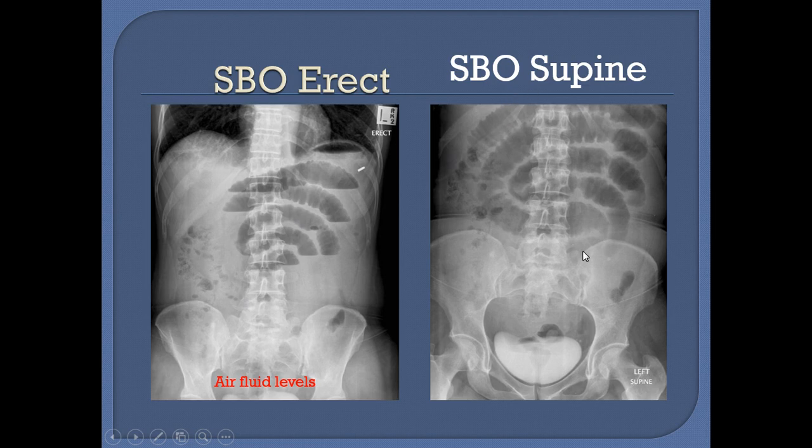Then the supine view, you can see this whole dilated bowel loops, and this is the contrast-filled urinary bladder. Maybe the patient had some IV injection or some barium which was not excreted properly and ultimately reabsorbed and comes into the pelvicalyceal system.